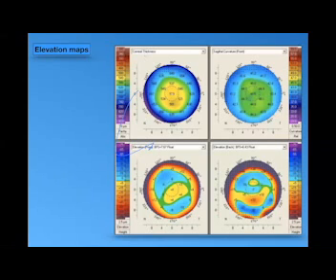What if I have a patient with a regular bowtie and no inferior-superior asymmetry, but just a steep cornea with a K reading of more than 48? Do you go for any type of ablation, like surface ablation, or would you hold off ablating this patient? You mean we have a steep point, but superior or inferior? Steep bowtie. I have a point of 40 in the upper part. Yes, but no inferior-superior asymmetry, just a steep bowtie in a patient with high astigmatism. Would you go for ablation or not?